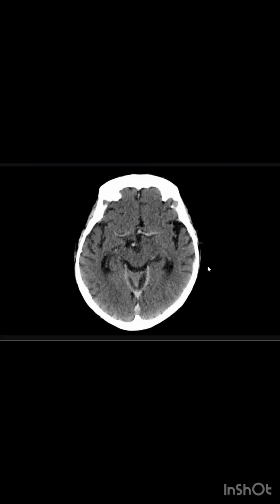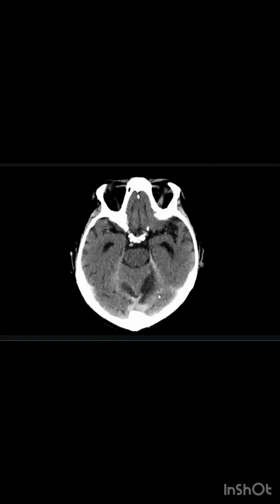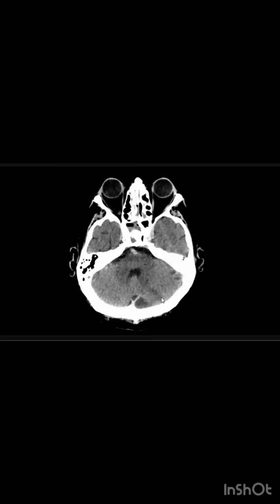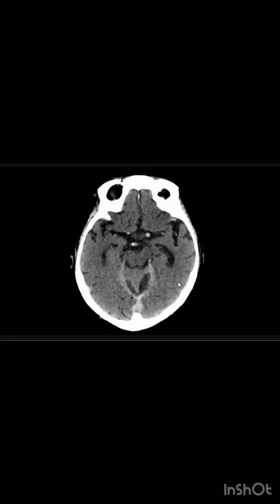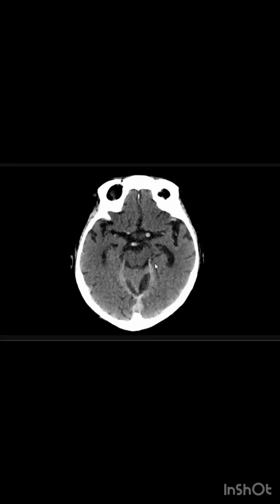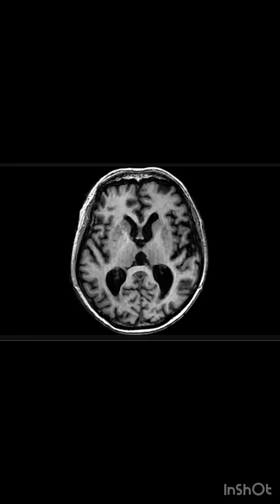it is not like MRI, but it gives you some hints about the enhancement of the collection. The collection is likely to appear peripherally enhanced. You did well, as there is enhancement here and enhancement here. You did well to comment on the sinuses; it is very important. Even after contrast, I need to take this patient further for a more accurate diagnosis, because it is an urgent case and management will be surgical. I need to do MRI for better characterization.